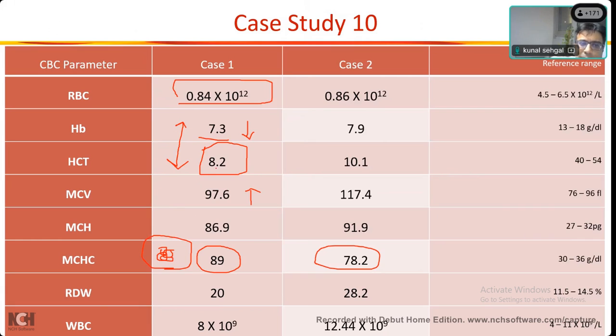So hematocrit becomes low. But hemoglobin measurement is not a problem because you're going to lyse the RBCs, whether they are single or clumped. So hemoglobin is correct, but the indices become wrong. WBC count is okay, platelet count is okay, but the RBC indices are not measurable in a correct fashion. So what can we do in agglutination?